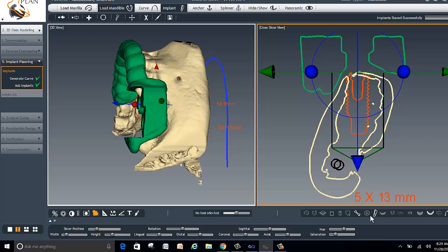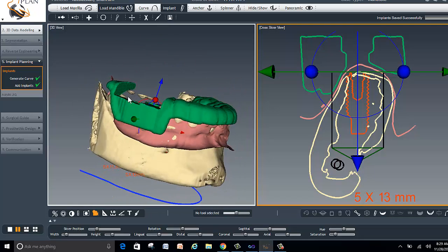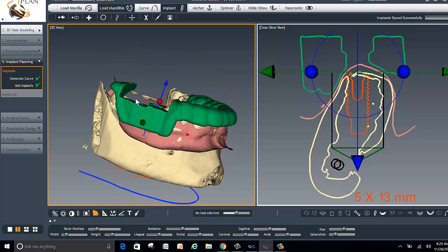And if I were to put the tissue, one more time, the tracing of the tissue, the surgical guide is usually designed with 0.5 millimeter allowance for the tissue so that it can compress the tissue if you have to, but it will be tooth-borne, and it's usually designed with a 0.001 tolerance to sit on the actual teeth. So this technically should conclude the treatment plan for this case.